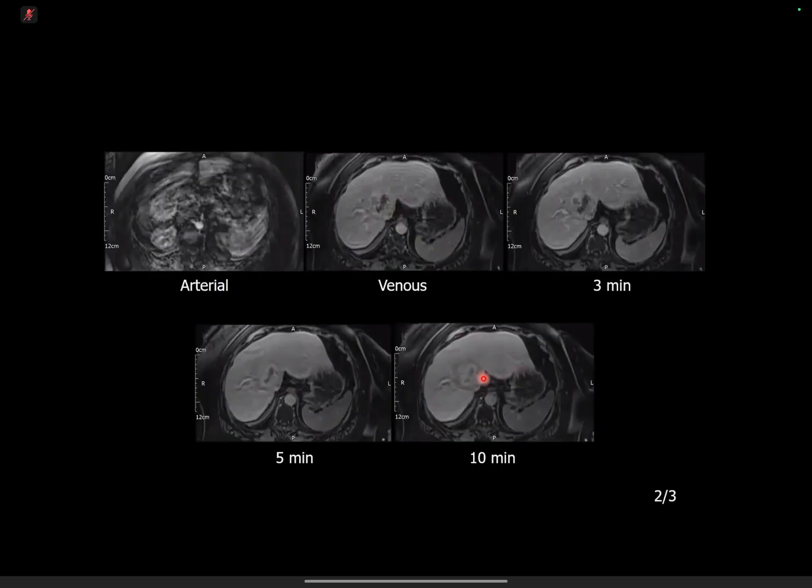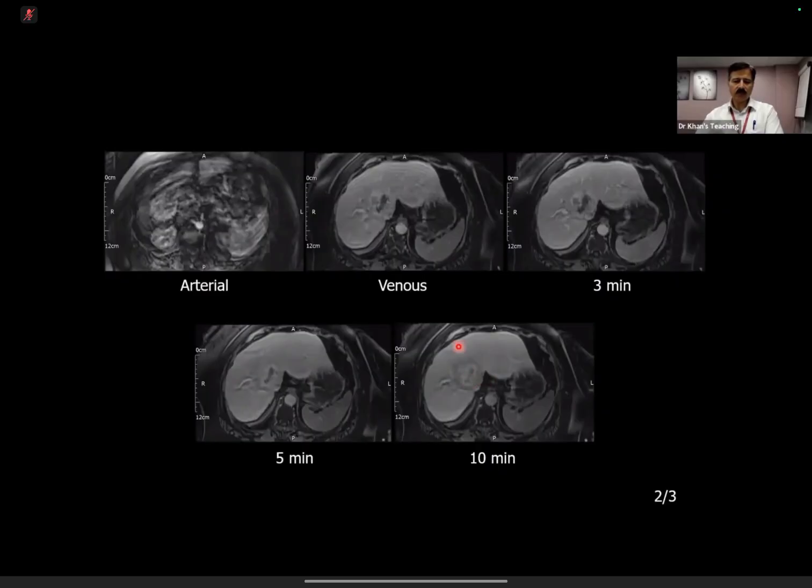Correct, yeah. Correct. And why you are confused is, and this is the teaching point here, and this is what I am going to teach you now. Why you are confused is because the central part has now enhanced, right? Agree? This is what has confused you. Yeah. So this looked malignant, but because of this centripetal, within inverted commas, enhancement, you are now confused.